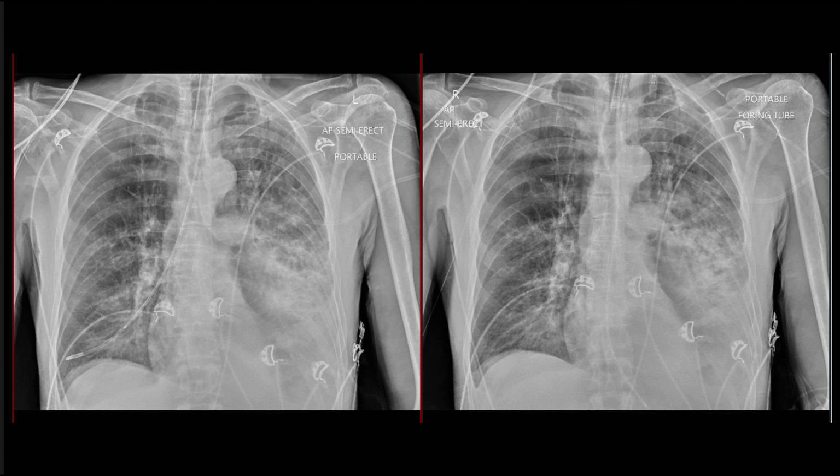This patient has dense consolidation in the left lower lobe, so this is a lobar pneumonia with extensive airspace disease bilaterally. And on the left panel, you can see that the nasogastric tube has been inserted down the right main bronchus into the lung. That was withdrawn, and then the tube was reinserted, and you can see that it passes down below the level of the diaphragm. And this is good medical care. That's why we do sequential chest x-rays in these situations.